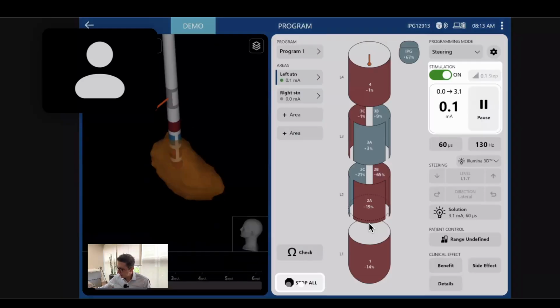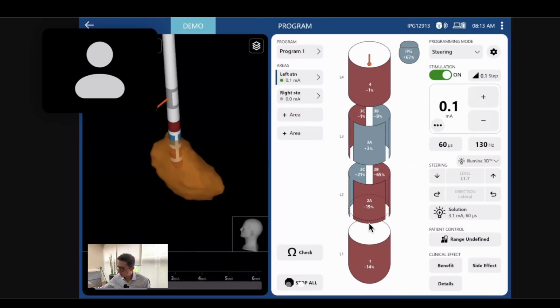And then imagine that you are stimulating your patient. One thing that you can do in your patient as a monopolar review, for example, imagine that your patient is sitting in front of you, and then you're going to increase the stimulation, okay? And then look at this VTA.